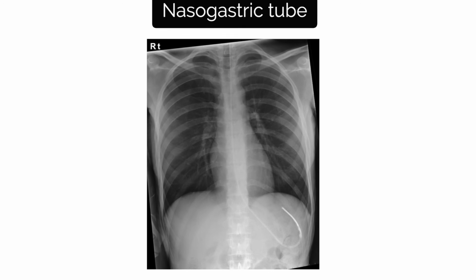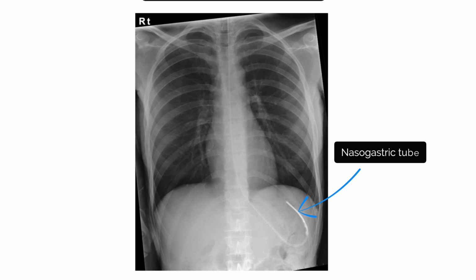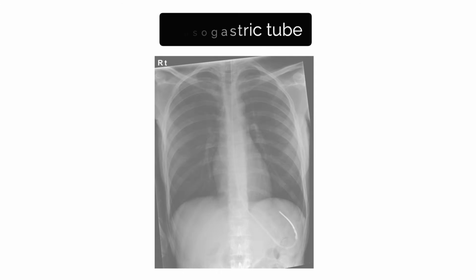In this film, we can see a correctly placed nasogastric tube. For further information on assessing the placement, check out our Geeky Medics article.